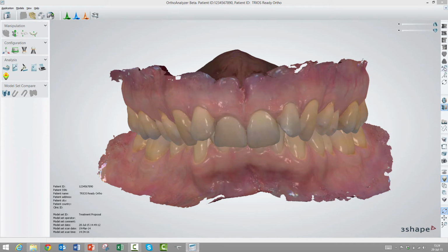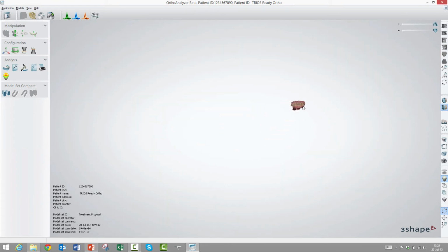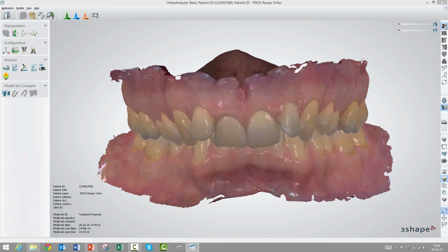So the next icon up here is what we call zoom all. It's basically a way that if you move around here, you maybe have a zoom level that's too small, you maybe have it out of screen or something's gone wrong. You can always get back to full zoom mode by simply clicking on this button here. It will go into a full zoom like defined in the system. So if you sort of lose your model somewhere, you can always get back, either of course by choosing one of the views up here, or by clicking this 100% zoom right here. I'll go to front view again.